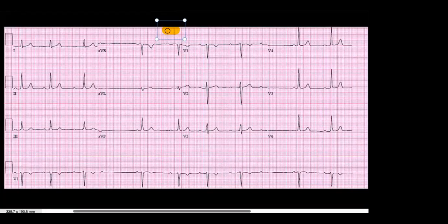For me, I would not call it a sinus rhythm, because if we stay on the second lead, as you already said, we have the P wave, then we have the QRS complex, and as it continues, you realize that it comes to a point where we don't have a QRS complex. So based on that alone, it disqualifies from being a sinus rhythm.